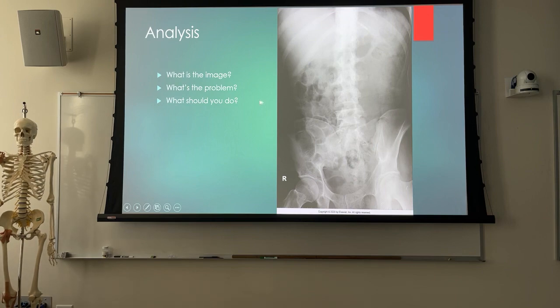You can also look at the position of the sacrum within what would be the birth canal. It's going to tilt towards the elevated side. So we've got a lot of stuff we can look at. We're getting to the point where we can see Scotty dogs on this one. So we've got some pretty decent rotation here. I wouldn't hand that in.